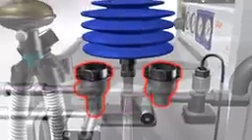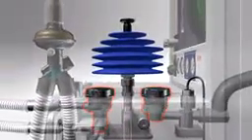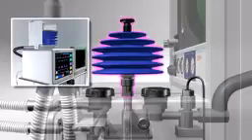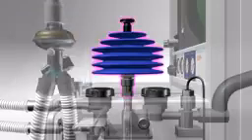During spontaneous breathing, both non-return valves open for inspiration and close during expiration. The UAM supports both automatic and manual intermittent positive pressure ventilation, or IPPV. The bellows between the one-way valves are used for manual IPPV.